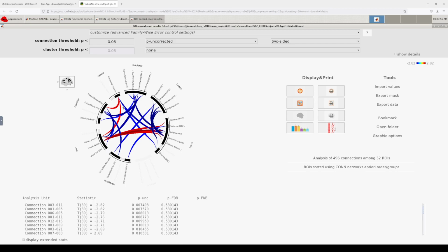But one thing we can get a sense of, and this is all between, so red is a positive association with age, blue is a negative association with age, and we're getting a hint, again, this is completely not statistically robust, but we can kind of get this hint that there might be some changes and some, I don't say weakening, these are actually potential. Blue, this is where it can be hard to interpret, but blue is a negative correlation, but that doesn't mean a problem.